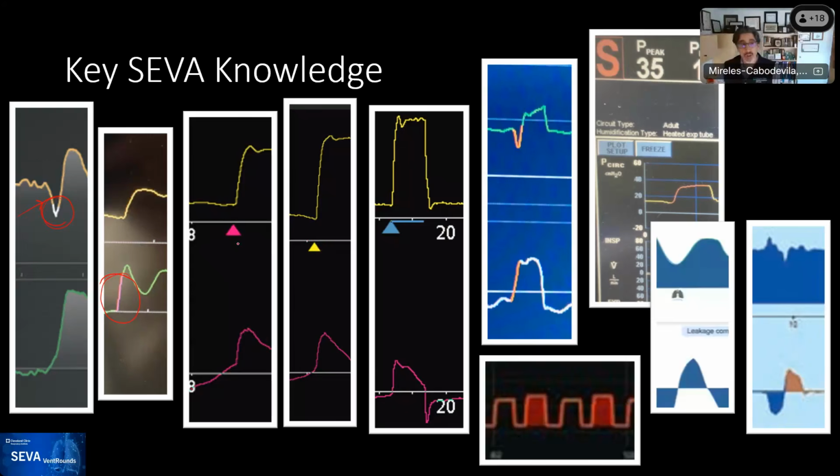You can certainly see here in examples number 2 and 3 that there is essentially no drop in the pressure that you would recognize. So if you did not have this marker, it may be hard for us to know that this is actually the patient. You could infer it, but it's hard. On example number 4, the one with the yellow triangle, which is pressure, you can see a little bit of that divot. And on example number 5, the blue triangle is talking about IntelliSync.